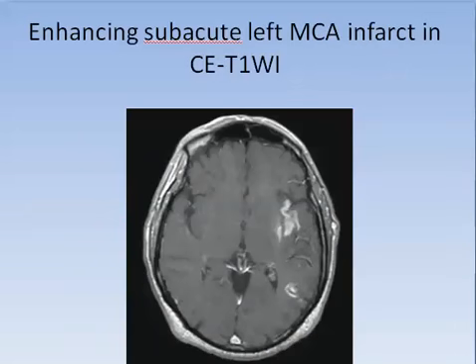Now here, after injection of contrast, in subacute infarct, there is enhancing subacute left middle cerebral infarct. Enhancing subacute left middle cerebral infarct. Subacute.